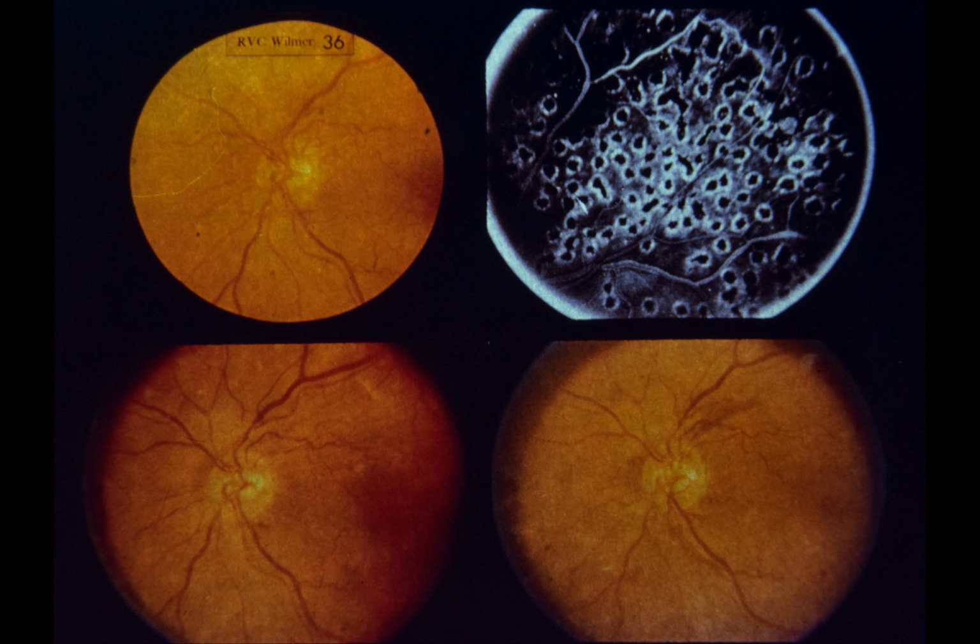Comment: although scatter photocoagulation treatment often promotes regression, if not complete disappearance, of disc neovascularization, follow-up examination in this case showed recurrence of disc vessels 1 year later. This case demonstrates that careful follow-up at 4 to 6 month intervals is mandatory for all patients with proliferative diabetic retinopathy. In some instances, additional scatter photocoagulation may promote regression of disc neovascularization.